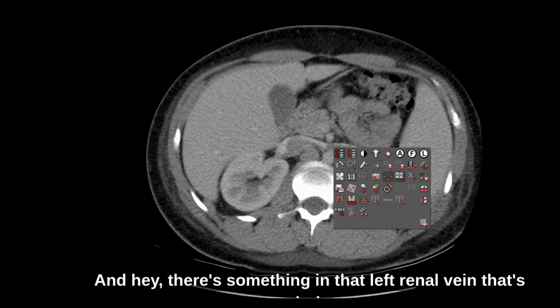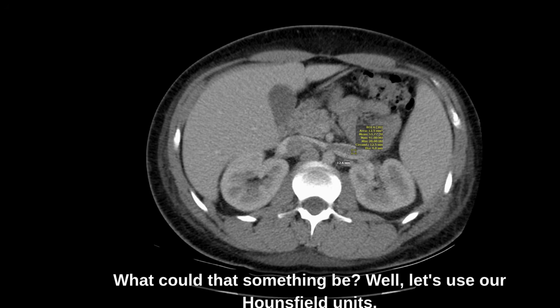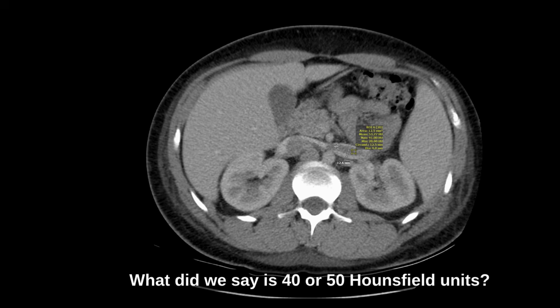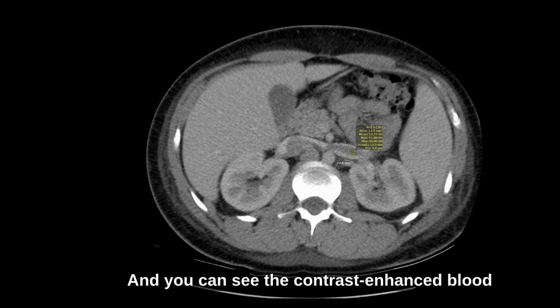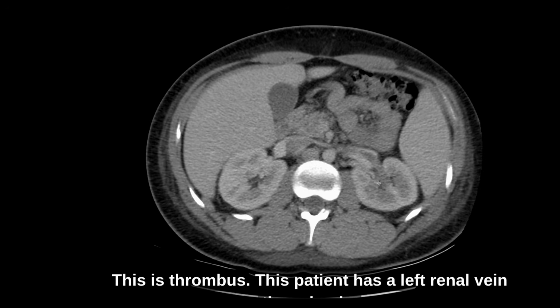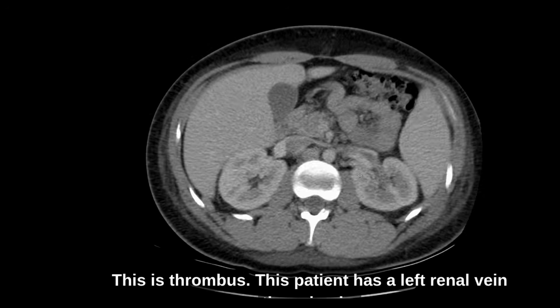And hey, there's something in that left renal vein that's dark. What could that something be? Well, let's use our Hounsfield units. And we get about 40 or 50. What did we say is 40 or 50 Hounsfield units? Well, that's blood. And you can see the contrast-enhanced blood in the left renal vein is a lot brighter than this blood. This is thrombus. This patient has a left renal vein thrombosis.